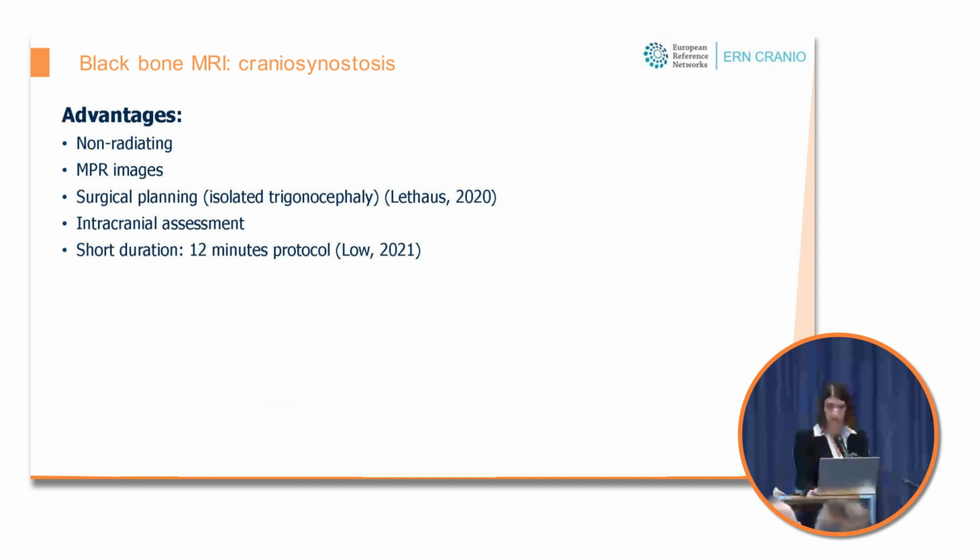A 12-minute protocol has been proposed to image craniosynostosis patients, thus reducing the need of general anesthesia, especially in young infants that can be imaged with the feed and wrap method.